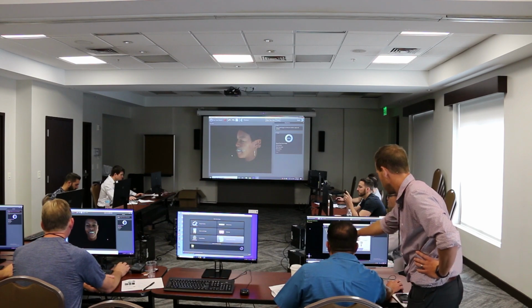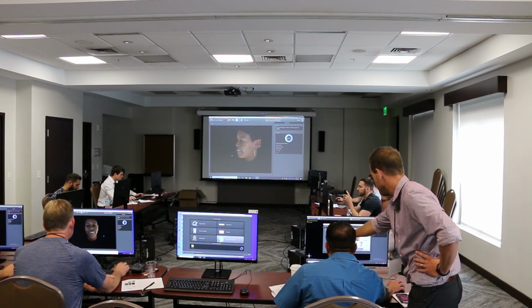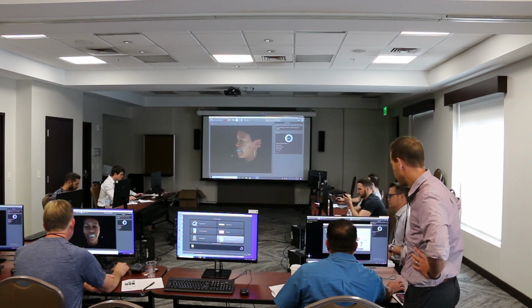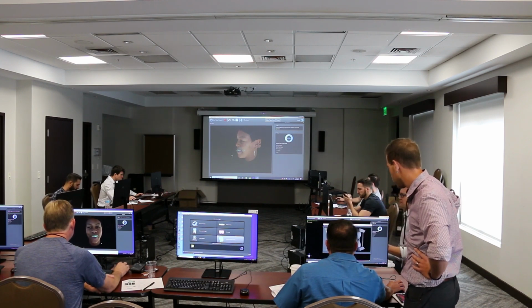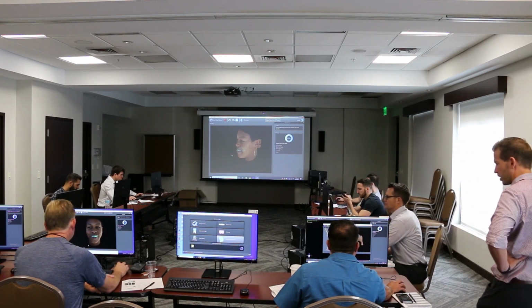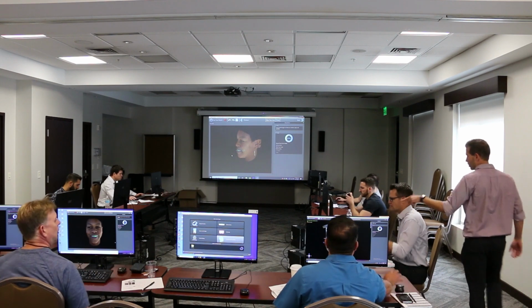And then let's click the folder, because that was the old one. That was the one I was supposed to click on right here. Yep, click that, and then click below that. Now this should be in color and populate that over there. Yep, and now you're good to hit OK. Alright. Good, okay, you got that?